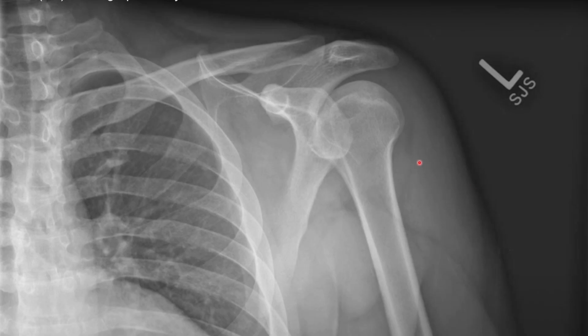This view is in the internal rotation, and the best way to identify the internal rotation is by looking at the head of the humerus. Notice how it's very symmetrical and has a light bulb-like appearance, as opposed to what we saw in the external rotation where the greater tuberosity was really prominently visible. So by identifying this symmetrical appearance, we can cue in that this is a view in internal rotation. These specific views are used to identify specific things. This view is really good for identifying Hill-Sachs fractures, which we'll get more into later on.